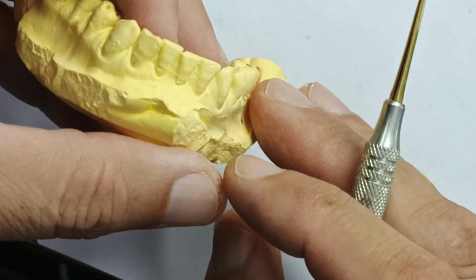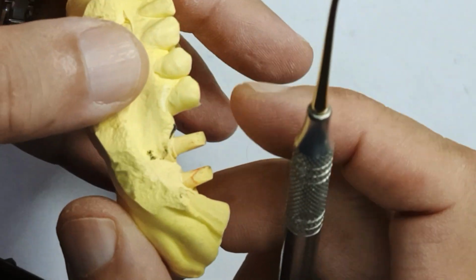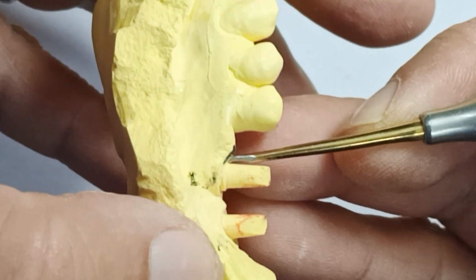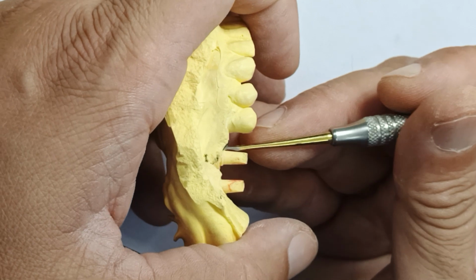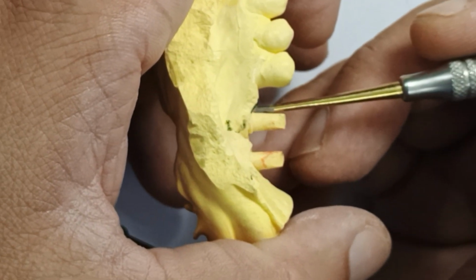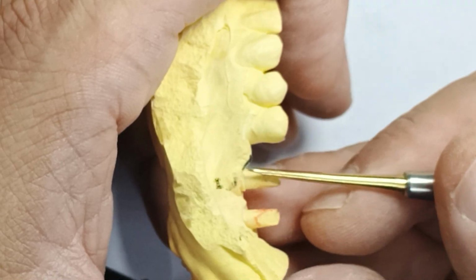Parallelism in this case is great. It's right down the center of the occlusion. That's good. But the first molar is too far distal. It should have been slightly mesial. This should have been a center. Look at the molar. It's about 7 to 8 millimeters wide. So from right here, the implant needs to exit at 3.5 millimeters. So this is one width too far. Now the crown that's going to be made would have a big bulge on the mesial, and the food impaction will happen there.